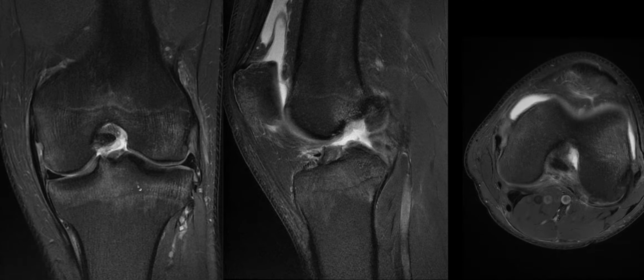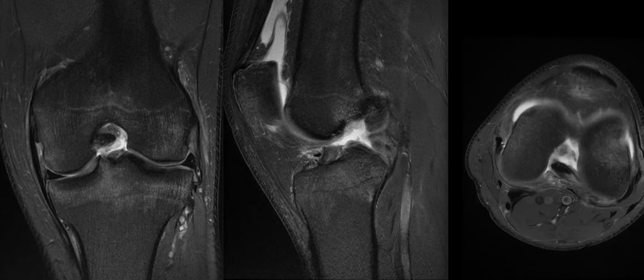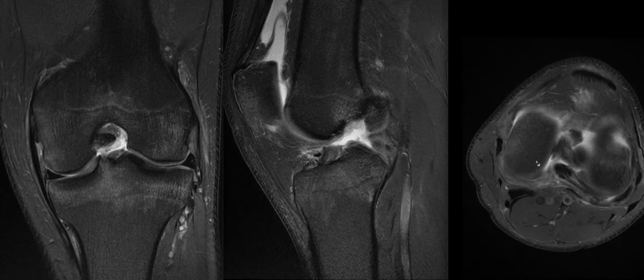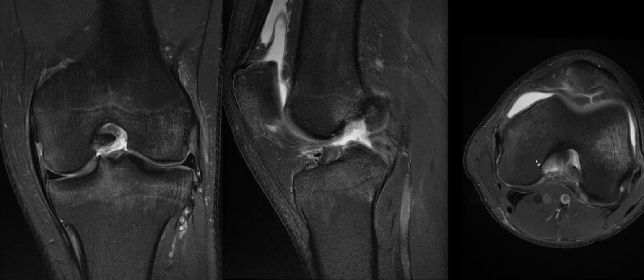Medial collateral ligaments are often associated. In this case, the ligament on the coronal images initially looks pretty normal, perhaps a little bit thickened in its proximal part. But on the axial images, we can see that whilst the posterior part is intact, extending into the posterior oblique ligament, there is an injury with soft tissue edema at the anterior margin where it attaches to the medial patellofemoral ligament. And this is a very common area for the ligament to be injured.